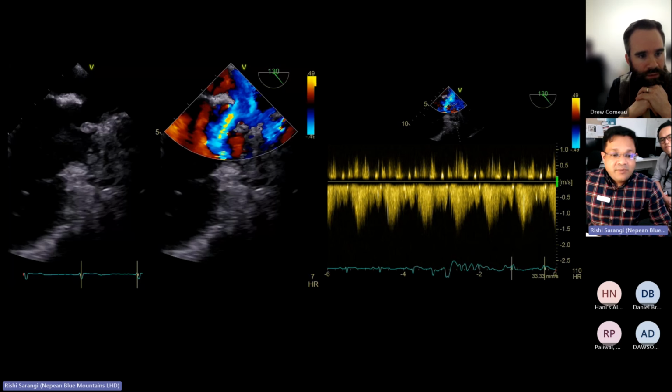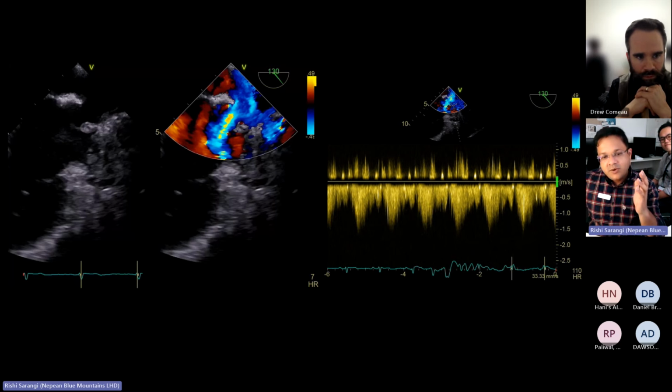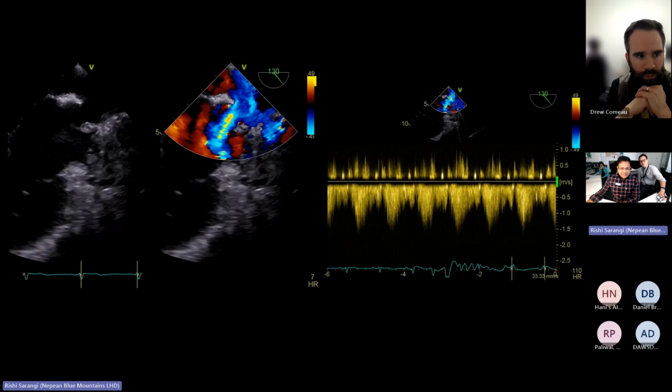So it was a case of partial anomalous pulmonary vein return with the right-sided pulmonary veins draining into the superior vena cava. And this is what was happening. And this explains the left to right shunt and the preferential RA-RV dilatation, which you can see. So if someone is young and you have RA-RV dilatation, always question what is the mechanism? A normal person is not supposed to have RA-RV dilatation, a healthy young girl. And this is the pulse wave which they have inserted over there.